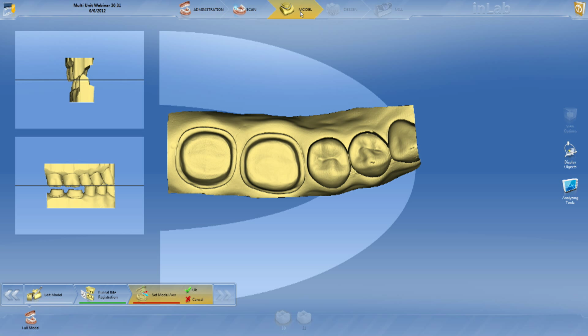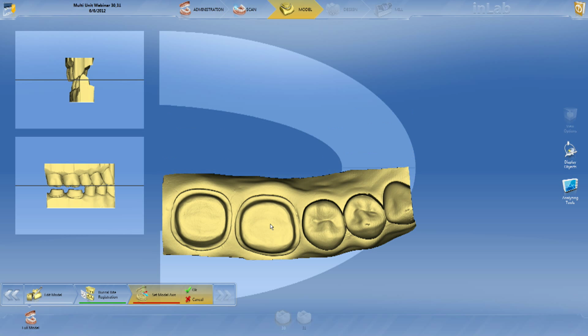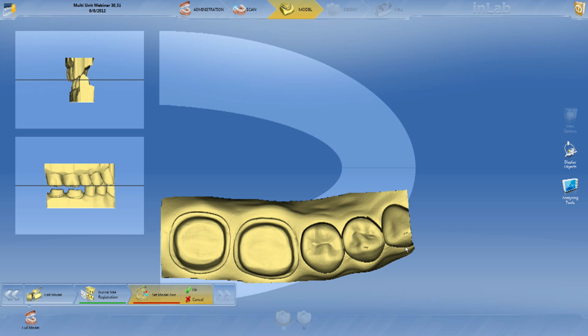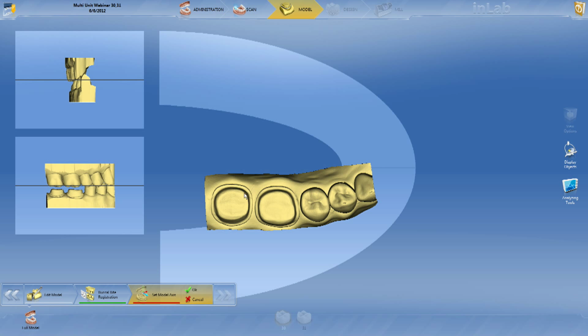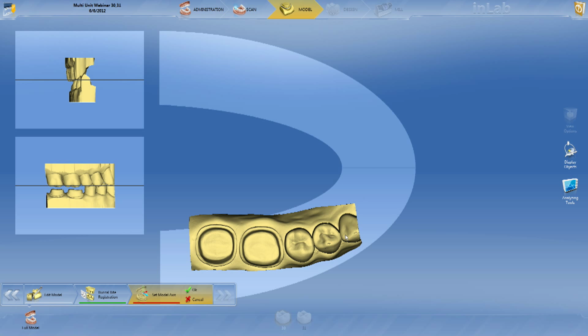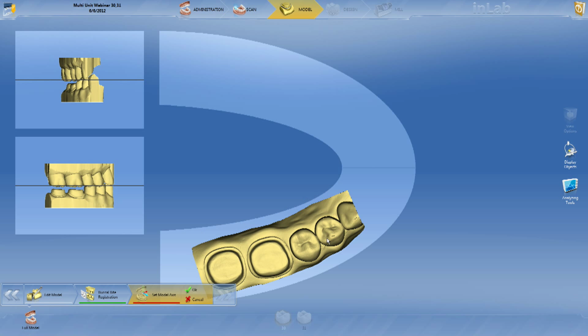Now, one of the things that with the 3.8, of course, we had our distal over here, our mesial over here, buccal, lingual, and stuff like that, and with the 4.0, we have a horseshoe. So, in some ways, I kind of like pretending like, yeah, the horseshoe is there, of course, especially when I'm working on a 30 and 31. I sort of don't follow the arch that much because I do notice that sometimes your tools are going to be facing that direction.